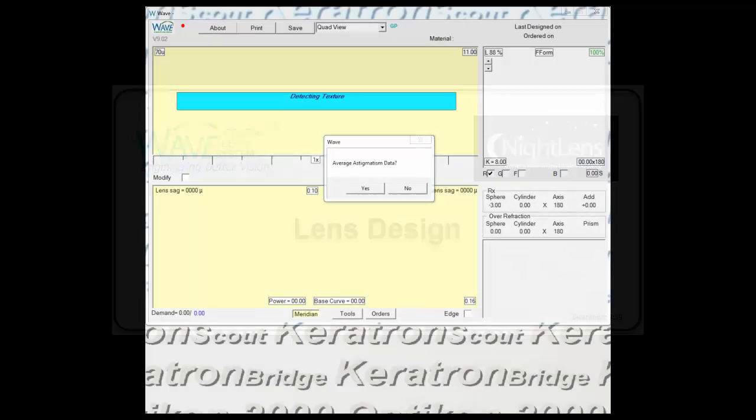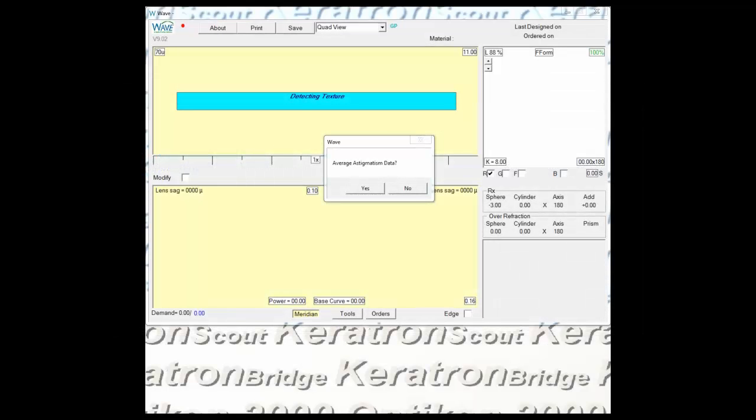In this segment, we're moving into actual lens design. The design process for VST OrthoK is pretty straightforward because a great majority of the patient analysis is done prior to this step. We've already evaluated quality of baseline topographies, selected a best map for editing, measured HVID for overall diameter determination, and then looked at the elevation map to decide whether we're using an R-SIM, G-SIM, or freeform design.